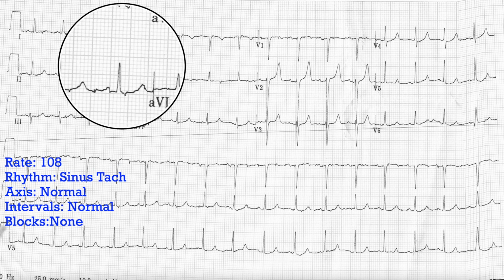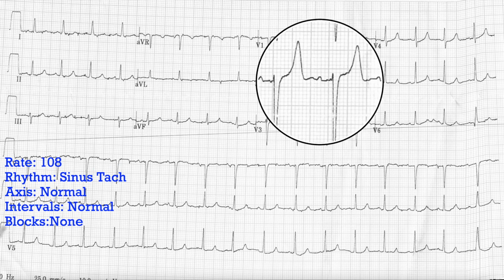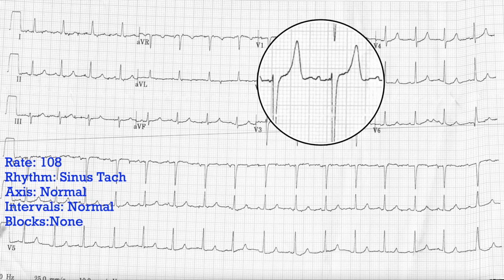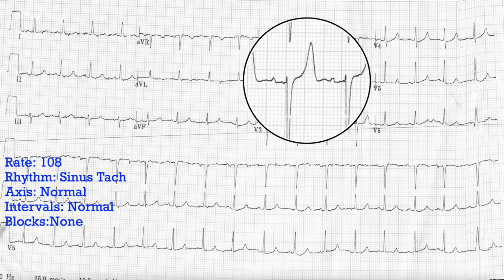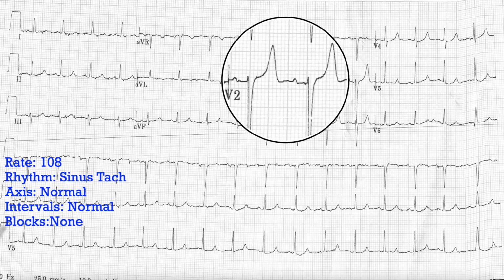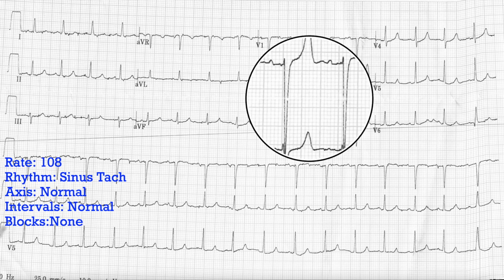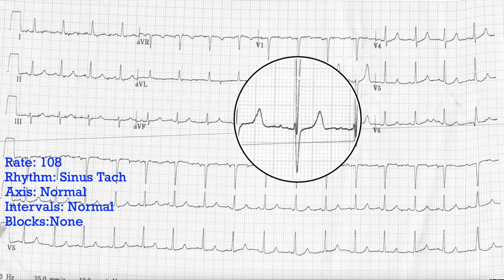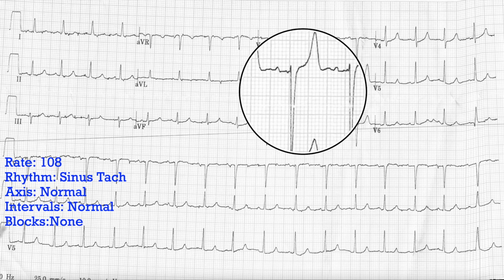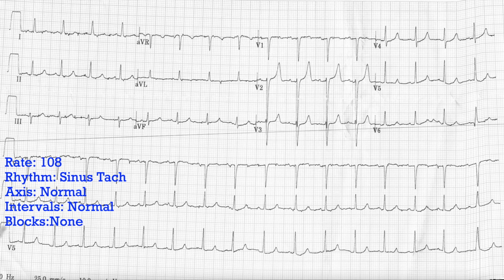When we look at our lateral leads, no ST elevation there. Tiny bit of ST elevation in V2 and V3. V1 doesn't seem to have much. V2, V3, but again, it is normal to have some elevation in V2 and V3, and this looks like just a box, which is well under the criteria that we would use to diagnose STEMI, and it looks wrong anyway, and there's other stuff going on. So we don't see significant ST elevation.